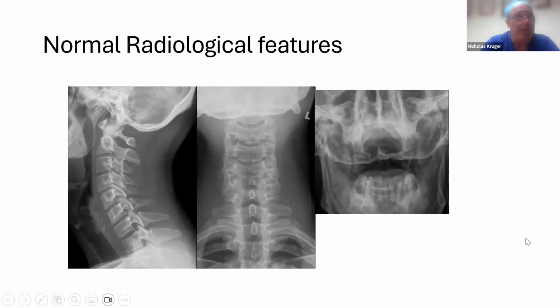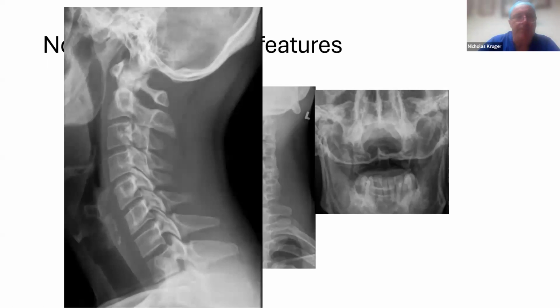Rob's quite big, and I am as well, on reading an X-ray properly. We don't even want to do CTs, but you can tell a lot of information from a simple X-ray. I'll just go through a line. For those who know it, that's fine, just refresh your memory.